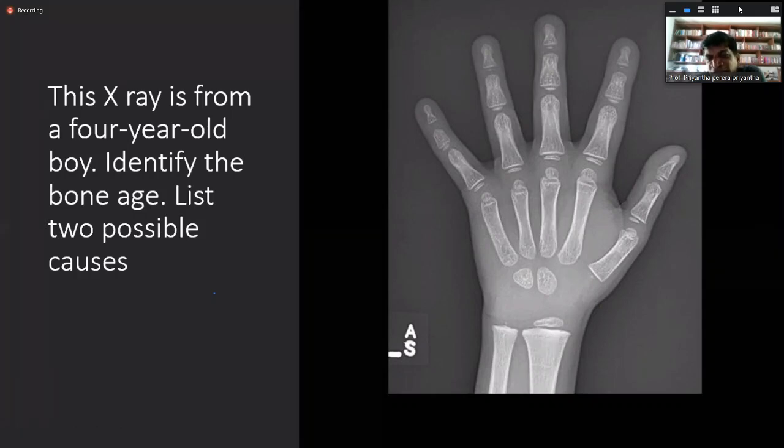So bone age is around between 6 months and 2 years, around 2 years bone age. I know this is the one that appeared last. So this appears around 2 years, right? Others have not appeared yet. So bone age is 2 years, right? So that indicates significant bone delay. So if another carpal bone was there, it will become 4 years. So you can't give the exact age, but you can give a range. You can give a maximum upper limit of the bone age, right? So that's how we calculate it.